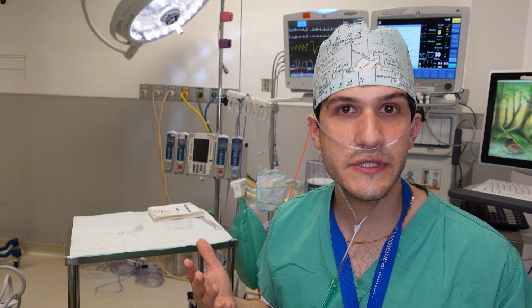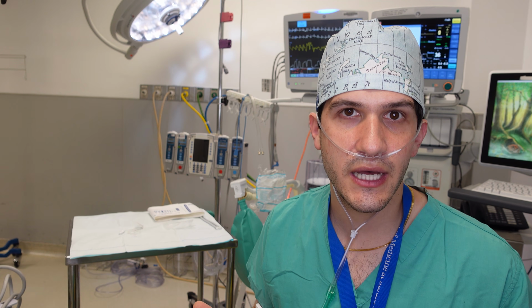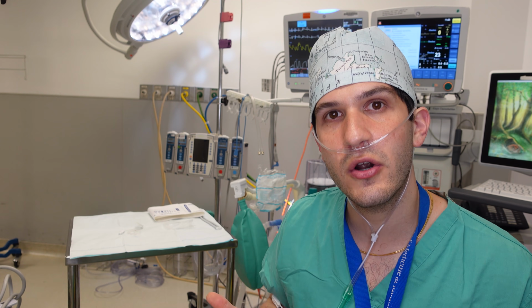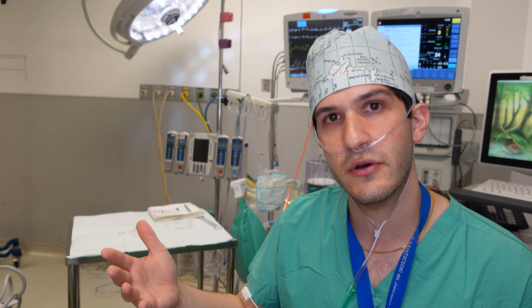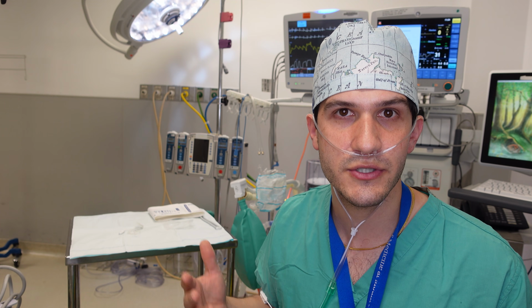My decision to use either non-invasive or invasive blood pressure monitoring is really going to be dependent on a number of factors, including how sick is the patient. Because if the patient is very sick, for example, they have a lot of cardiac pathology, and I'm concerned that there might be major changes in blood pressure as I'm inducing anesthesia or as the surgery is going on, then I'll want to know on a second-by-second basis what their blood pressure looks like.